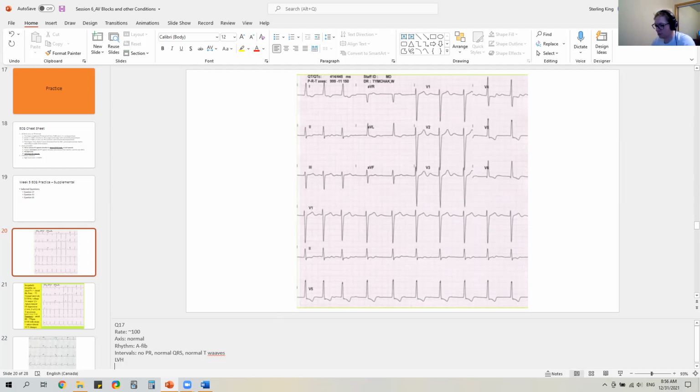Looks like then left ventricular hypertrophy. I don't think right. It's not high enough for lead V1. And then we're going to check our lateral leads for Q waves. Nope, no Qs. I check for ST. It looks a little bit depressed. Yeah, ST depression. T waves, inverted, inverted, inverted, inverted.